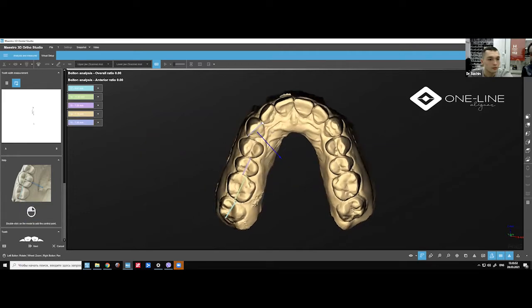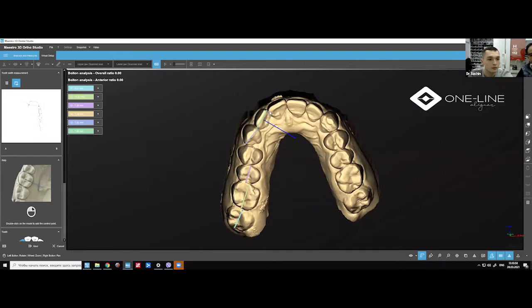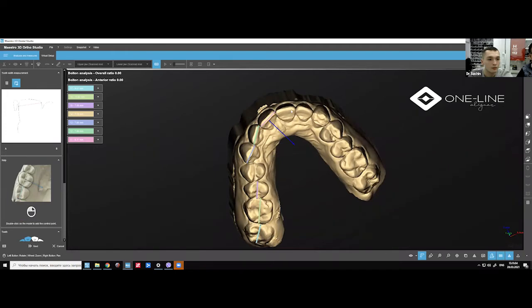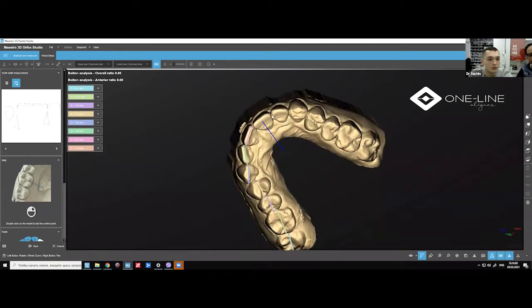I hope this part will also be very interesting for the doctors or technicians who are new to the software. So you can actually see somebody who is doing it. He's doing around 20 to 25 segmentations a day. So he's pretty used to it.